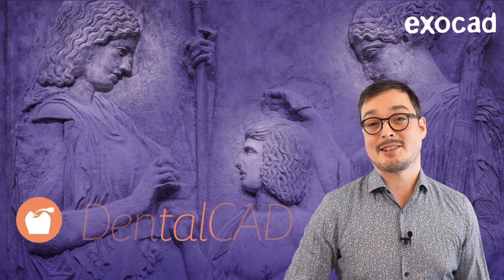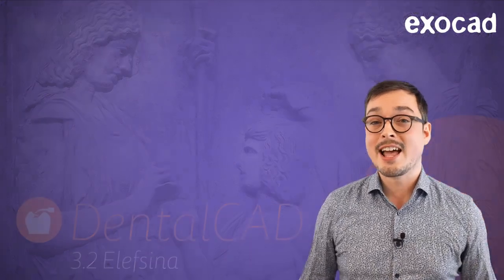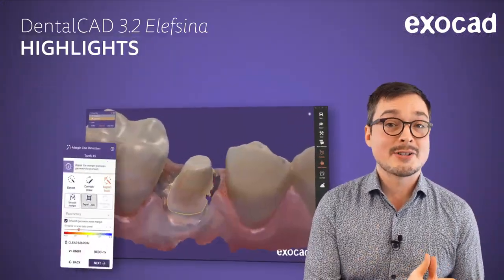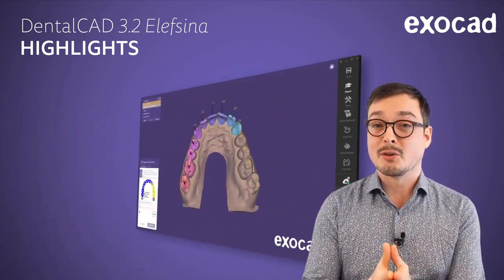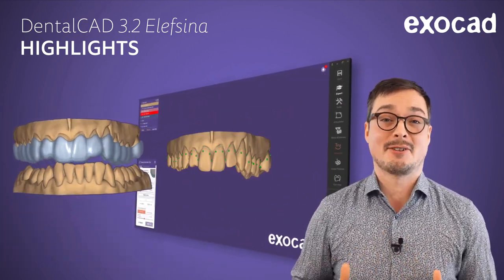Get ready for the next evolution in design. In this video, we are proud to present to you the highlights of DentalCAD 3.2 Elefsina, like the margin repair tool that allows you to make the most of imperfect intraoral scans. The Splint module offers more design speed and automation.